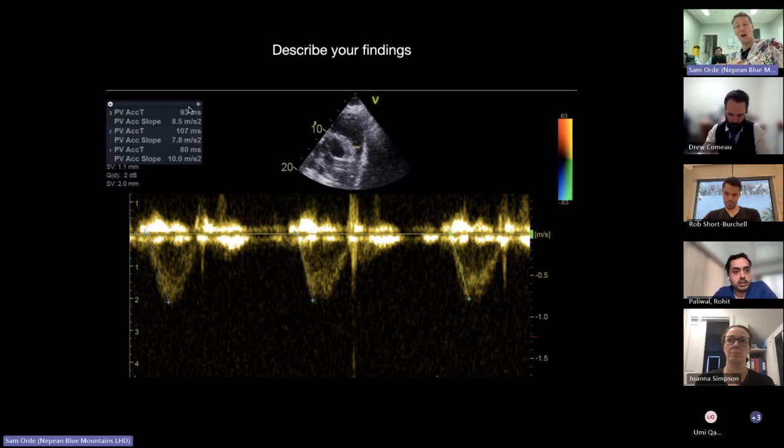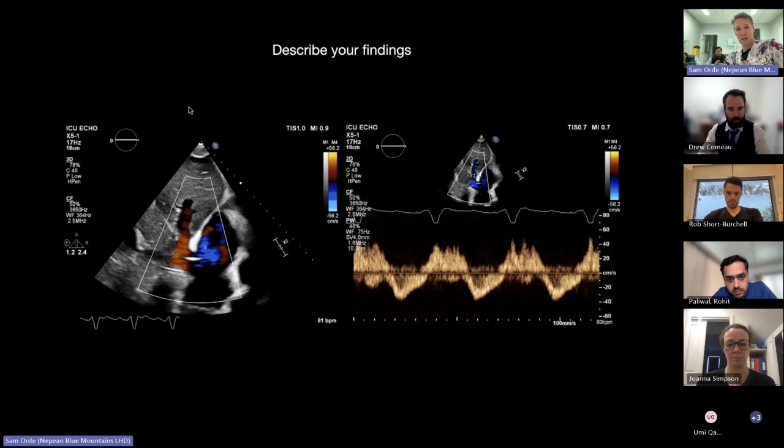Yeah, this is really good. So this is a guy who had horrible ARDS, and we actually couldn't get much from doing it in the parasternal, and we got this from the subcostal, which I thought was quite nice. Otherwise, beautiful. Yeah, good pass. This one you smashed. That's excellent.